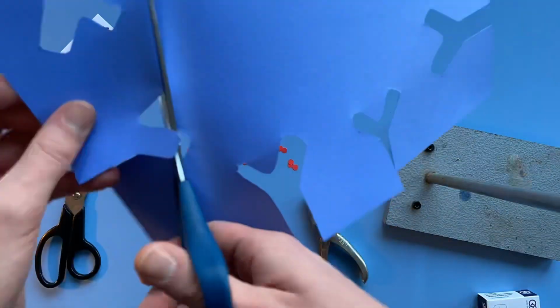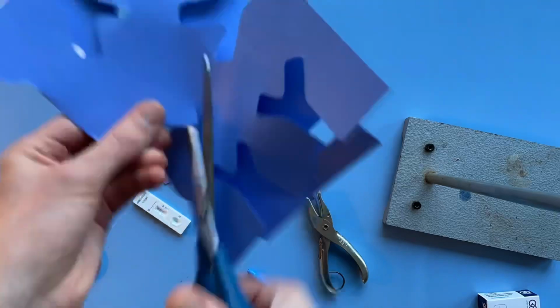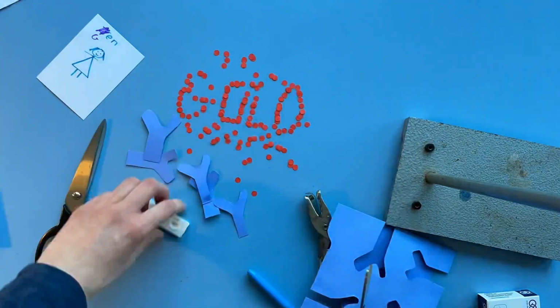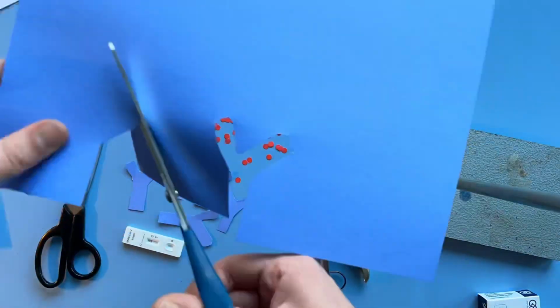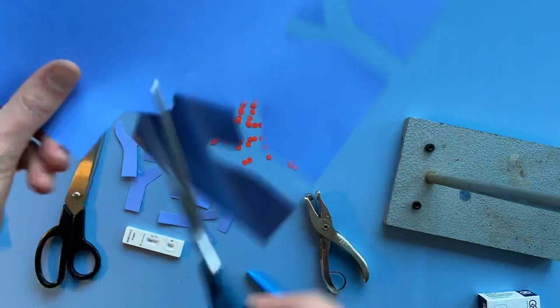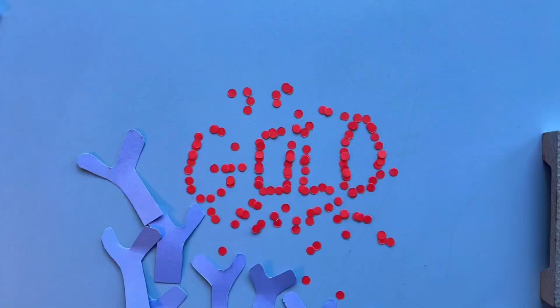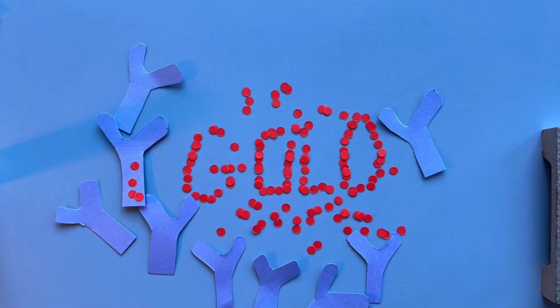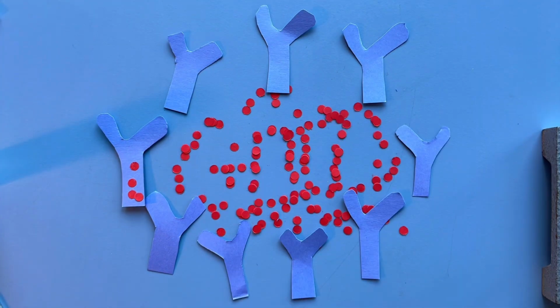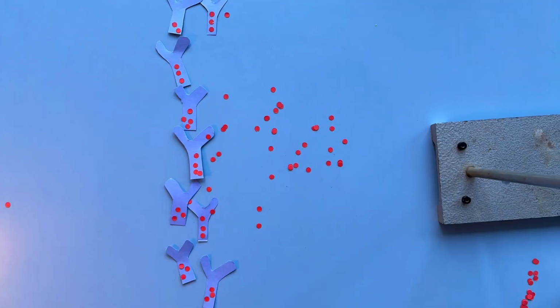The antibody proteins are Y-shaped. They kind of look like somebody standing with their arms raised up, like they're doing the Y in the YMCA. And their hands are out, and they're specifically designed to attach to the amino acids on the coronavirus spike protein. So they're very useful for this test. The antibodies are so small, though, that the only way we can see them is if we tag them with gold. So we take those gold nanoparticles and attach them to the antibodies.